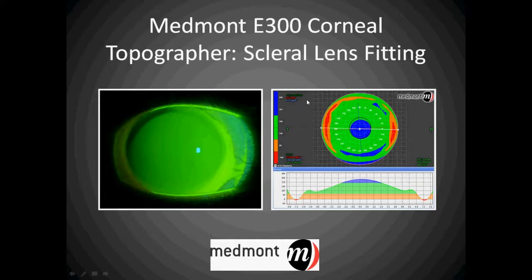This video describes the fitting of scleral lenses using your Medmont E300 corneal topographer and Scleral Sag factor.